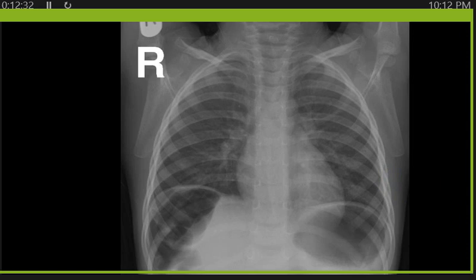What do you see here? Overinflated chest, sir, showing gas lucency. We have abnormal gas lucency under the right hemidiaphragm. What is the characteristic of the gas here? Yes, there is haustra crossing, as we see through the gas shadow. We see here there are haustra of the gas.